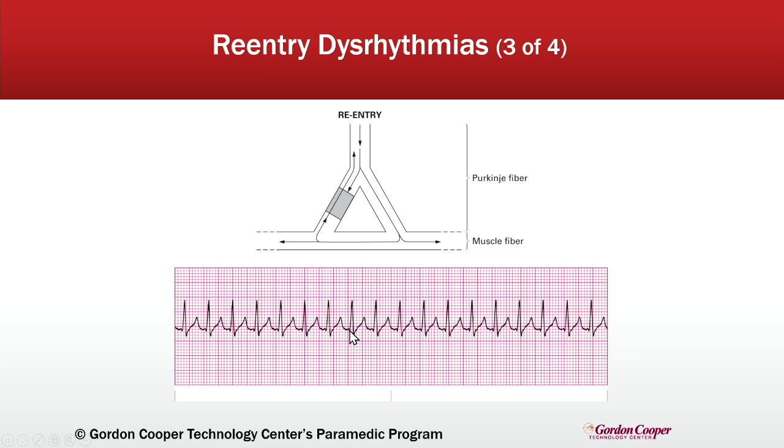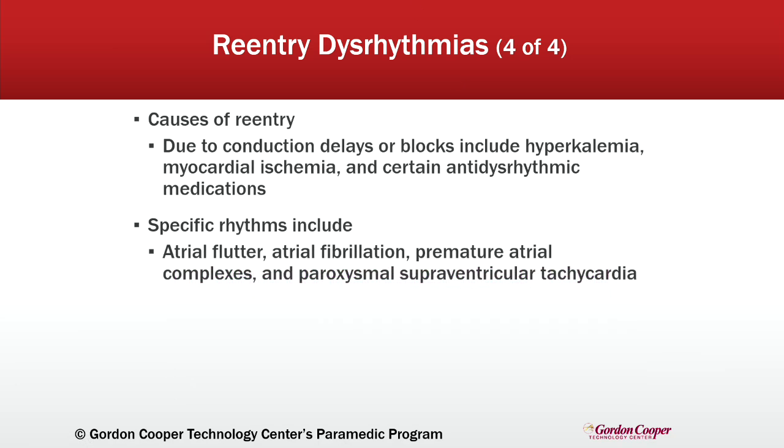However, what typically happens is this heart rate is going so fast that it's hard to see the P wave because it almost just gets smushed in there. So the PR interval, if that is the PR interval, we're probably talking about a very, very short amount of time. So when we talk about SVT, it's very common to not see your P wave.